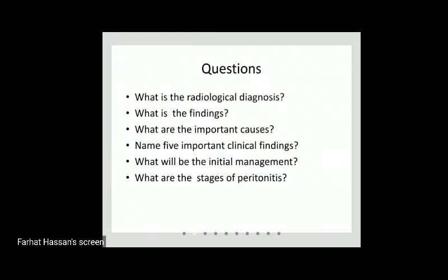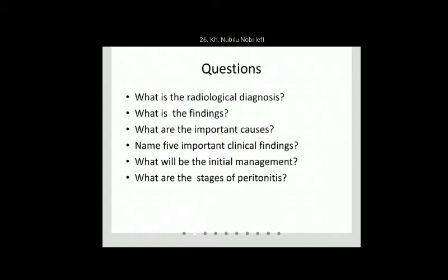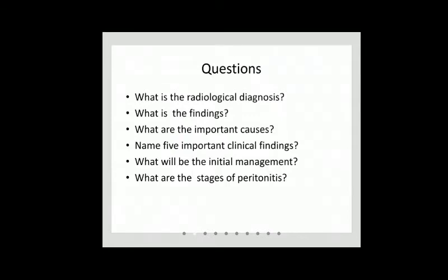Then typhoid ulcer perforation, tubercular ulcer, malignant ulcer. Next, either due to blunt or penetrating abdominal trauma, traumatic abdominal injury, either blunt injury or penetrating abdominal injury. Following laparotomy, even after laparoscopy, following laparoscopic gas insufflation, these all may cause pneumoperitoneum. There is the free gas under the right dome of diaphragm.